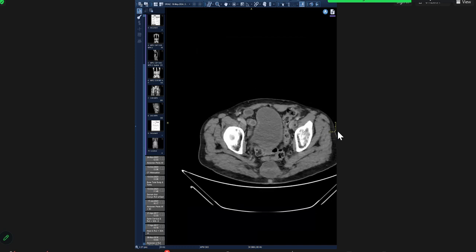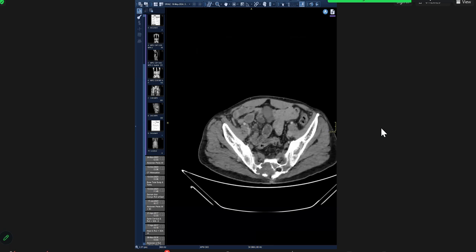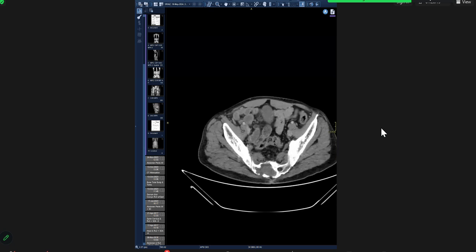Okay. So you see this again, midline. Yes. And see the destruction. Yes. So this could also be a midline mass. Whenever you see a midline mass, always consider that chordoma could also be one of the diagnoses.